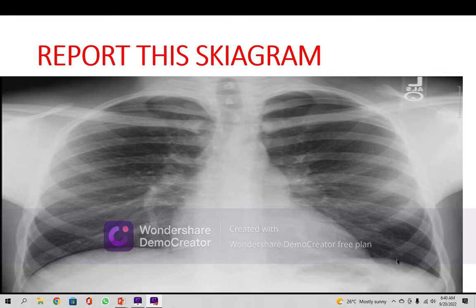So I measured it, and after measurement, it comes to me, for example, 18 centimeter, 20 centimeter, 20 centimeter. Then I measured the maximum breadth of the cardiac shadow, from here to here. This is the maximum one, about 11 centimeter. Because half of 20 is 10, and it is 11 centimeter, it means there is cardiomegaly in this patient.